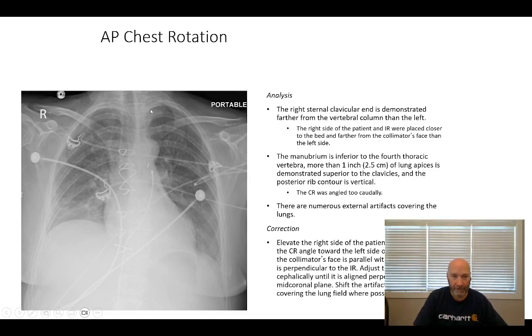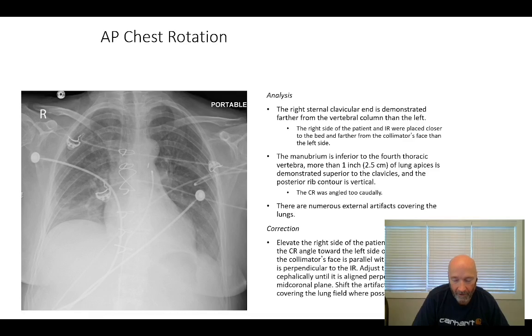We also have another issue with this image. The positioning of this image: this is the first rib, second rib, third rib, fourth rib, all the way down to the fifth rib. We see the fifth rib, it looks like it's going directly into our aortic arch. And what that means is that we've got a misangulation or a mispositioning in my mid-coronal plane as well. So mid-sagittal plane rotation gives us our true rotation, but mid-coronal plane tilt gives us something different.